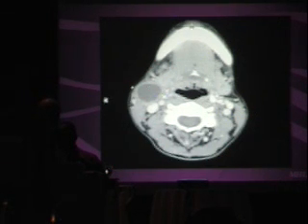In this location, just around the carotid artery, the external carotid, internal carotid, jugular vein, what else lives in that anatomic location besides potentially a branchial cleft cyst? What normal tissues? There's nerves that run there, cranial nerve 9, cranial nerve 10, around that carotid sheath. So this could be a cystic schwannoma. On T2 bright, it can very often have that myxoid or mucinous appearance. So you should always have schwannoma in the differential of this appearance.